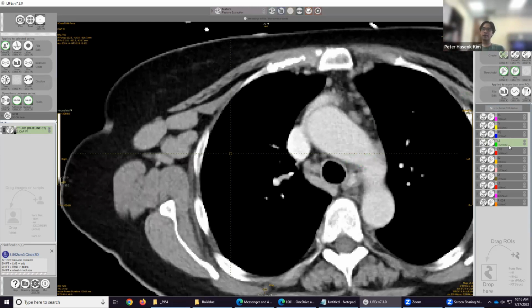And so the first lung that you collect might be anywhere from 1 to 3 volume. Here you can see the volume below each ROI. For L3, the volume is 14 cubic centimeters. You want one of the volumes to be pretty small, around the 1 to 3, 1 to 4 range. You want the next one to be around the 4 to 7, 4 to 8 range, and the third one to be pretty big, like from 9 to 20, 30, 40. Doesn't really matter. You just want a nice variety of sizes across a big range. Maybe the biggest you can go is 50.